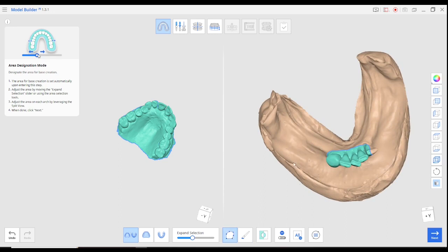So let's start off by putting it a little bit wide. I can always go back and add to it and move it. It's not a problem. Don't need all of this. So obviously I'm not going to extend it all the way out here.